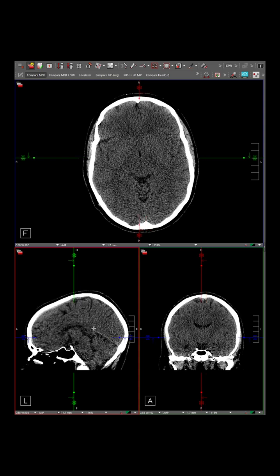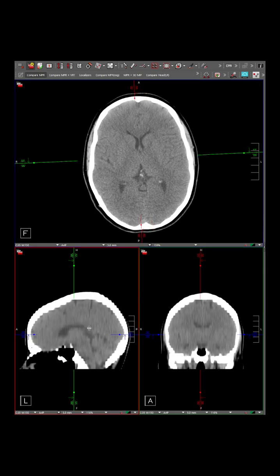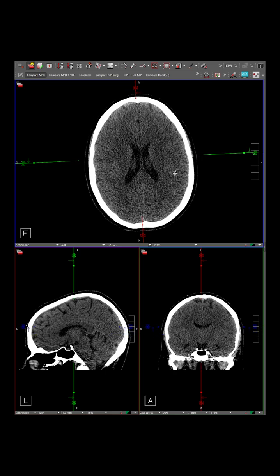We'll come to that in a little bit, but just to bring in that same set of images, here is an MPR viewer where we've brought in the thin section images of a non-contrast CT head. Now, you're going to want the thin section, because if you bring in the thick, you'll get this slab artifact. So you want as much of the granular thin section data as possible.